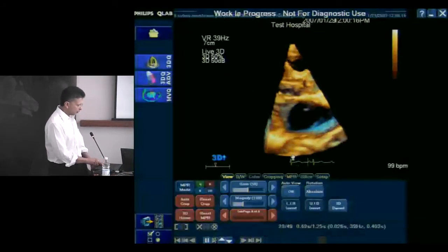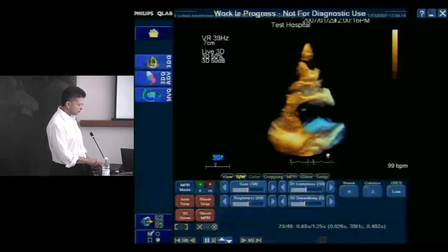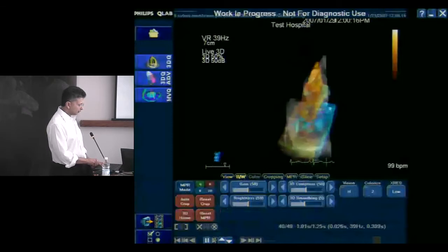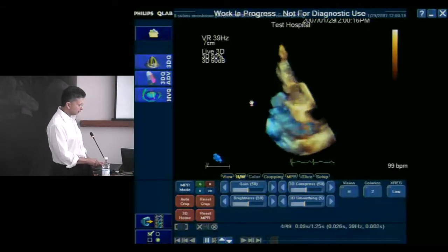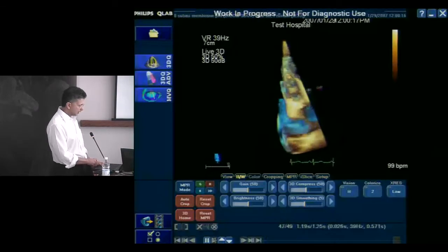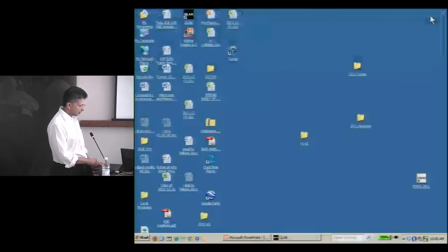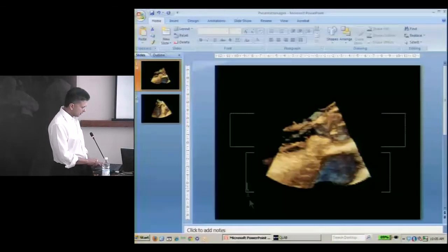And then a subaortic membrane. So this is a circumferential subaortic membrane. You see it from looking at it from below. There, below the aortic valve, you see it there and there. And then I've got a PowerPoint couple of slides to show you, and then I'll be done.